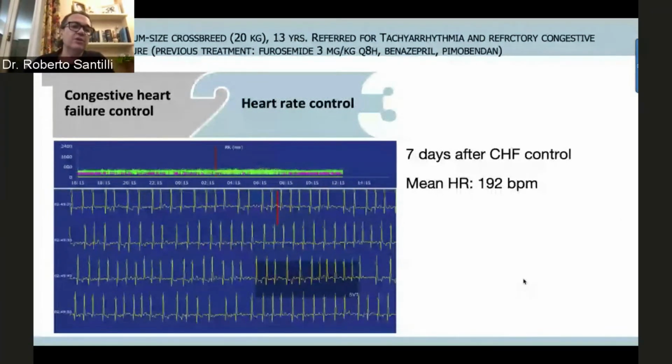So with the Holter, this is the tachogram. Remember, when you have atrial fibrillation and you look at the tachogram, you are not looking at the sinus node function, but at the AV node function. And in this particular case, if you draw a line here around 400, most of the day and night this dog has a heart rate above 160, 140. So this is not good.